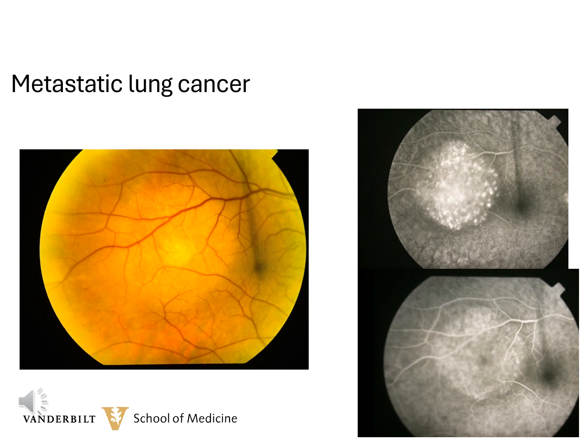The patients can develop metastatic choroidal lesions from a number of tumors. The most common one is lung. However, I've also seen metastatic tumors from breast as well as from the kidney and the prostate. This patient has a metastatic lesion from the lung. You can see that there's some hyperfluorescent spots. These are not the tumor vessels themselves, but it has damaged pigment epithelium, and you've seen some window defects and hyperfluorescence from that. Then overall, there's some late leakage from the tumor vessels, although you don't see the vessels directly.